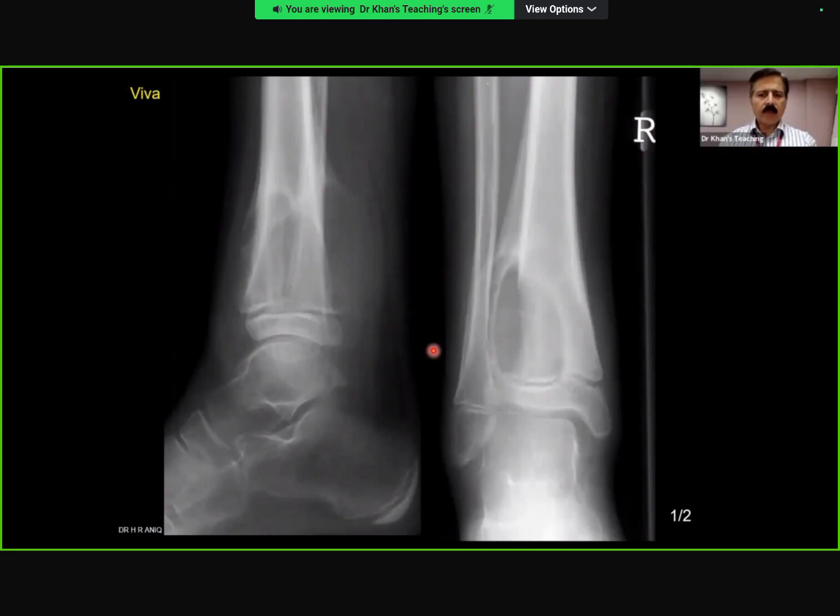Okay, I am happy with your thinking of an aggressive lesion, so I'm very happy with that. But why Ewing's and why lymphoma? It is a cystic lesion, isn't it? Aggressive, and I was thinking what aggressive lesions would I expect for someone that age. It isn't osteoid, which makes me think it's less likely to be an osteosarcoma.